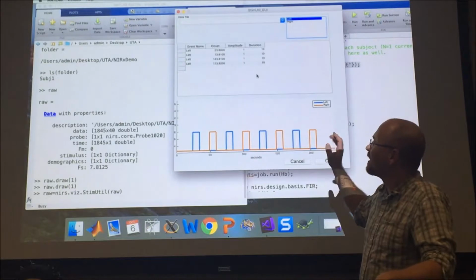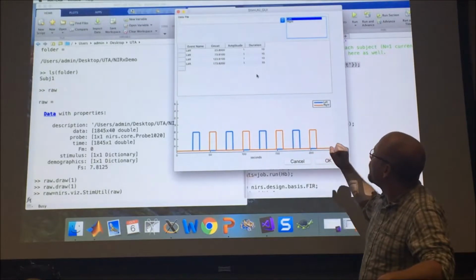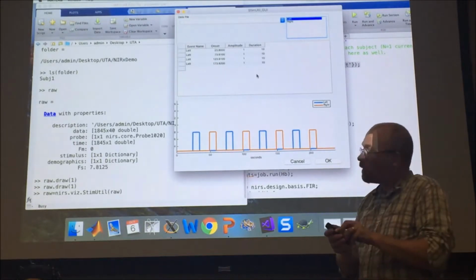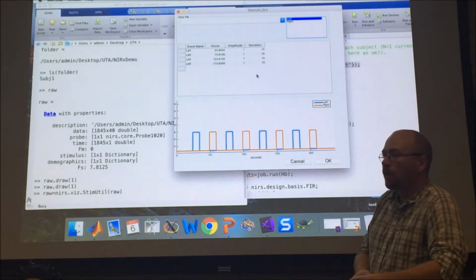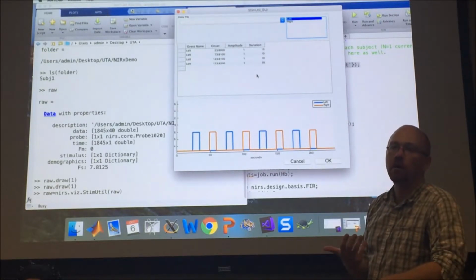So it still has a little bit of bugs in it, like it doesn't quite import Excel files, stuff like that. But it's working okay for now. We have in this stimulus information this field amplitude, which is all 1 in this case. What amplitude can be used for is that my toolbox allows you to deal with what are called parametric models.